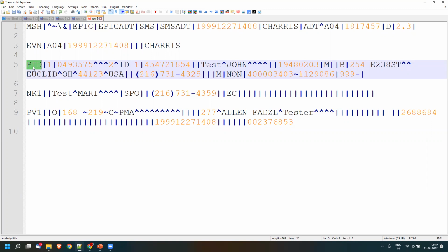If you are capturing patient name, date of birth, gender, SSN, and other details like marital status, insurance information, and guarantor information when the patient is getting registered, whatever data is captured during registration has to be sent out to the other system. So the HL7 message contains whatever you are capturing in the front end, but systematically organized in the form of this particular message.